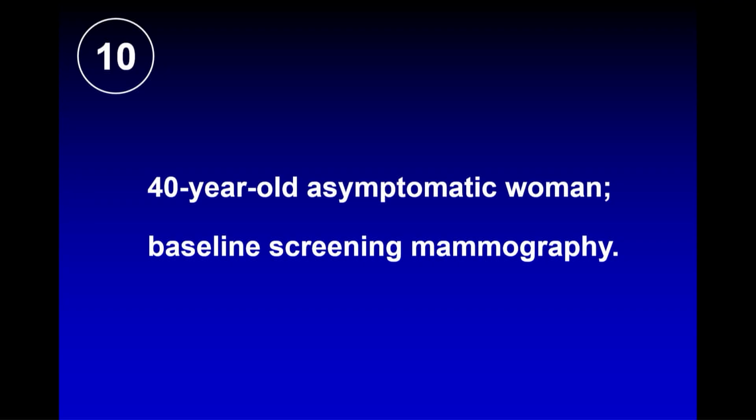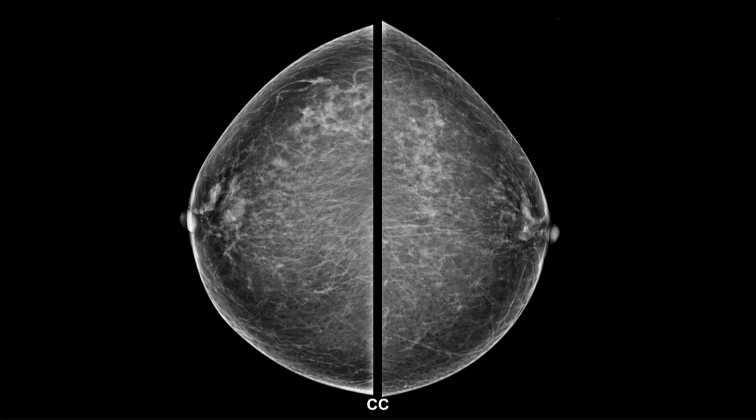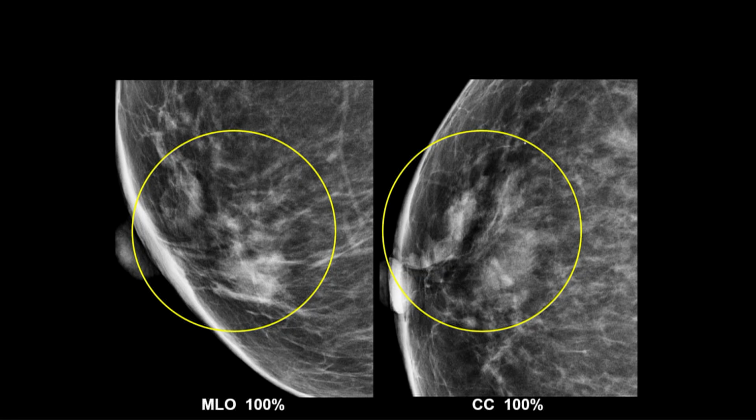Okay. This one is asymptomatic. I'm just reading my notes to see where the finding is and what it is. This is a complex case. Okay, there's a finding here, and that would be a focal asymmetry. It wasn't on the other side. It's a multi-component focal asymmetry. Okay, it got recalled. Nothing else was seen about it during the recall. We didn't have priors, so this was put in probably benign.